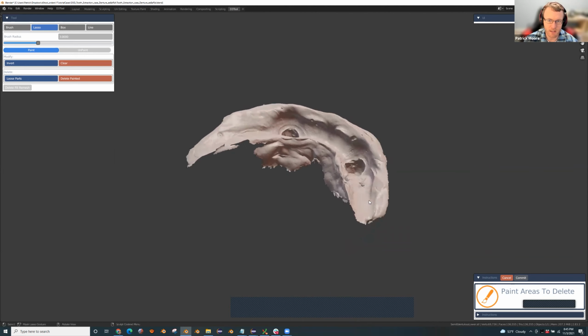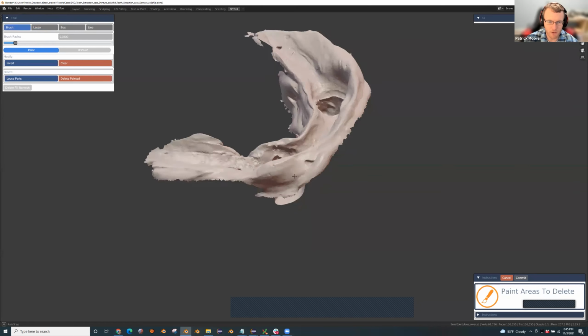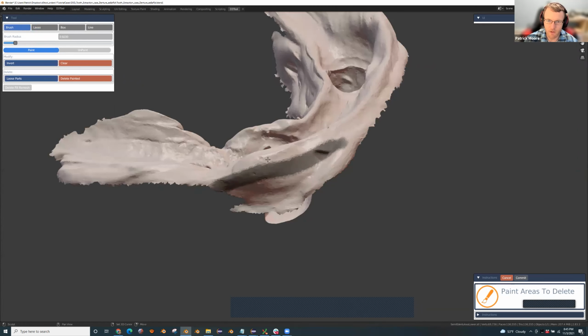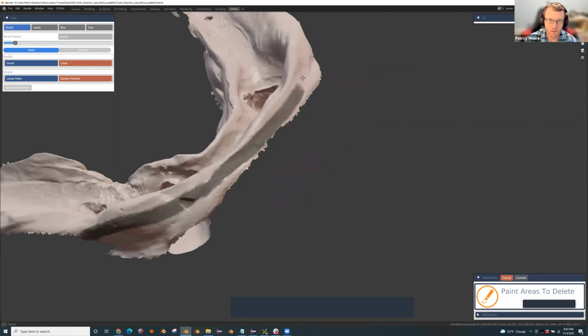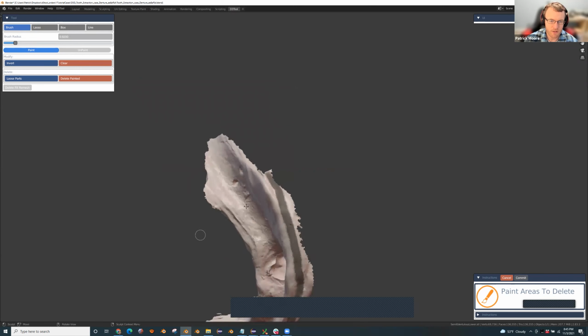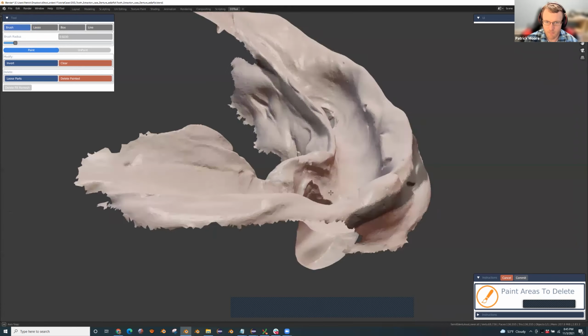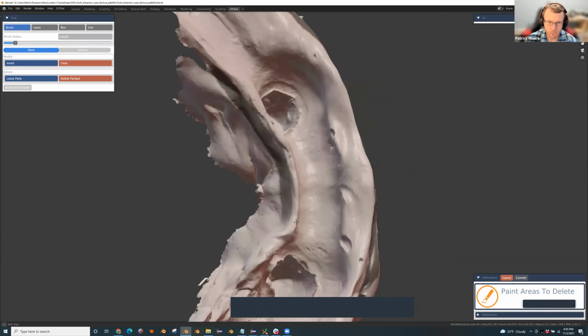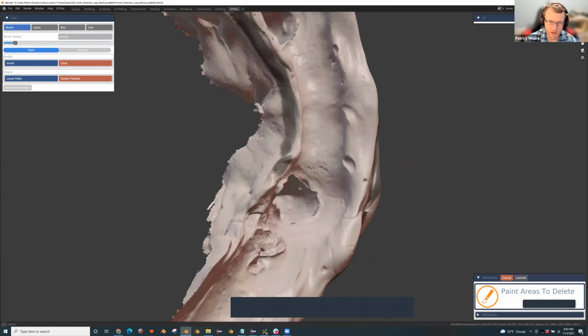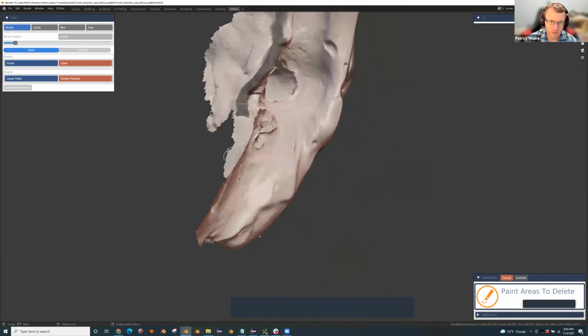All right, so I'm going to clear what I've painted here and then actually do this now that I've given just a slight intro to how the tools work. So I'm going to switch to brush. I'm going to make my brush radius just a little bit smaller here and just paint right along the impression here. Same thing down here. And there's about 1,000,001 preferences in terms of how you actually execute these border trimmings, but this is how I like to do it.